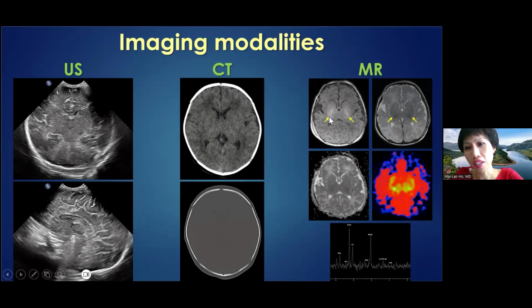So this T1 shortening, myelin is fat and protein, right? So you're going to get T1 bright, T2 dark kind of signal here. And so it's pretty much that posterior third to posterior half of the PLIC that should be myelinated if you're a full-term infant. Obviously, if you're preterm, it might be a little less. But if you're not seeing it at all or barely, then you have to be suspicious that maybe there's something obscuring it, right? Like maybe an edema from a hypoxic ischemic injury.